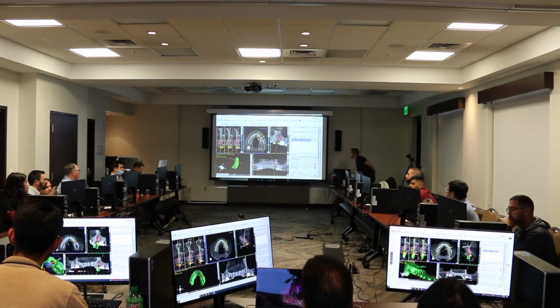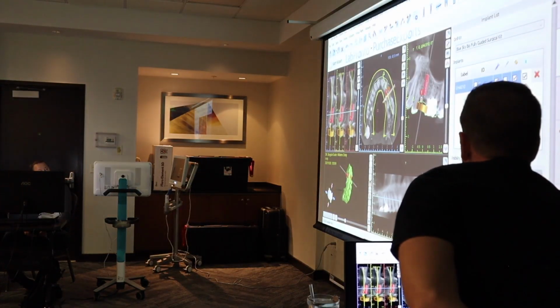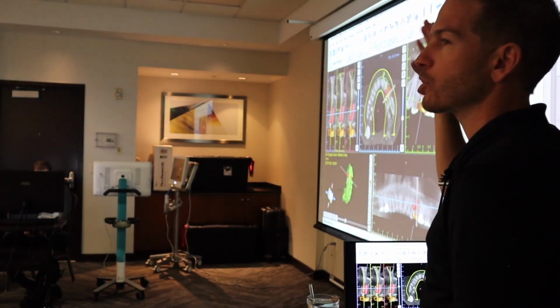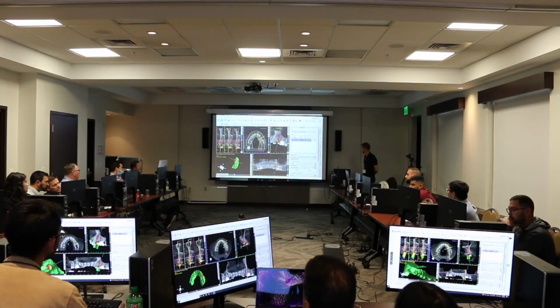And the last section is the padlock. So the padlock is to lock your implant. Once we're done, go ahead and lock that implant because that means you can't accidentally click and move it and screw up the position after you've already set it. So go ahead and lock it because that's helpful.